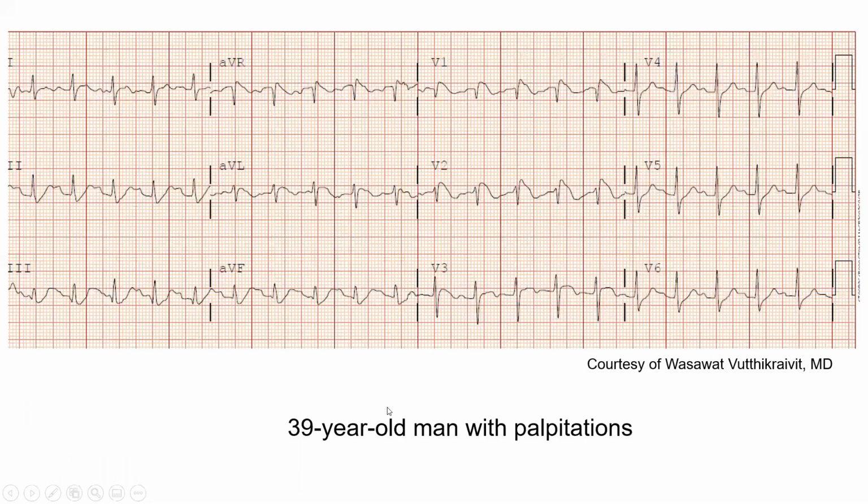Keep also in mind, he's tachycardic. Well, are you sure he doesn't have PE? PE can give you the exact same EKG. I've seen it in the past. I showed it in my prior talk. Very similar ST segment in PE. So think in the proper context: could this be PE with RV injury that looks like Brugada?